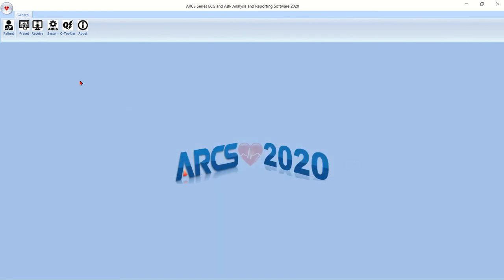That concludes this section. In the next short video, we will go over patient and the list for blood pressure.